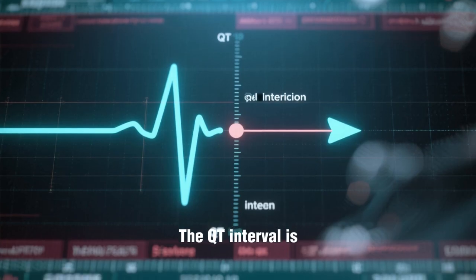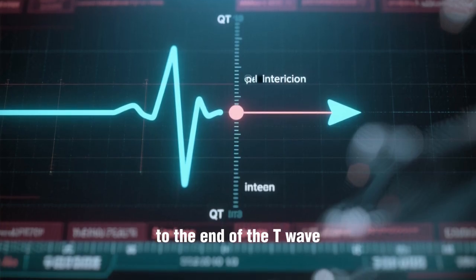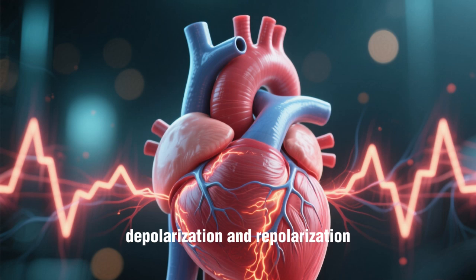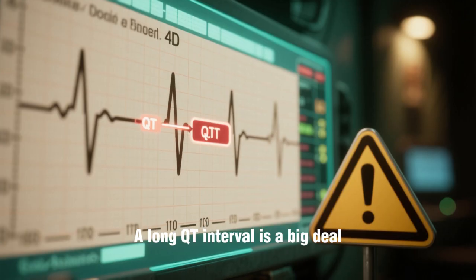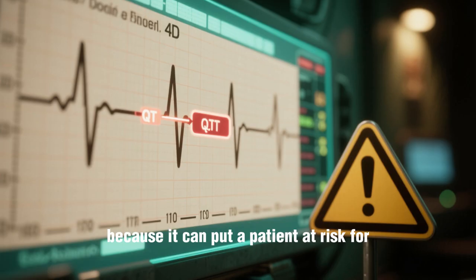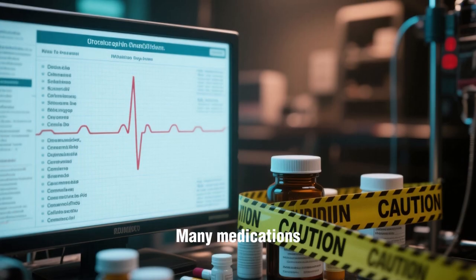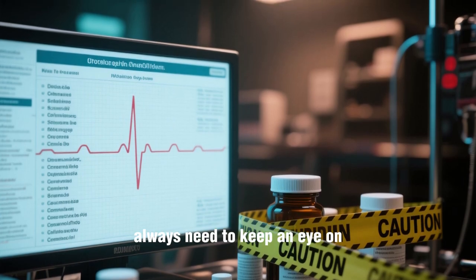The QT interval is measured from the start of the QRS complex to the end of the T wave. It represents the total time for ventricular depolarization and repolarization. It's the action phase of the ventricles. A long QT interval is a big deal because it can put a patient at risk for dangerous ventricular arrhythmias. Many medications can affect the QT interval, so it's something you'll always need to keep an eye on.